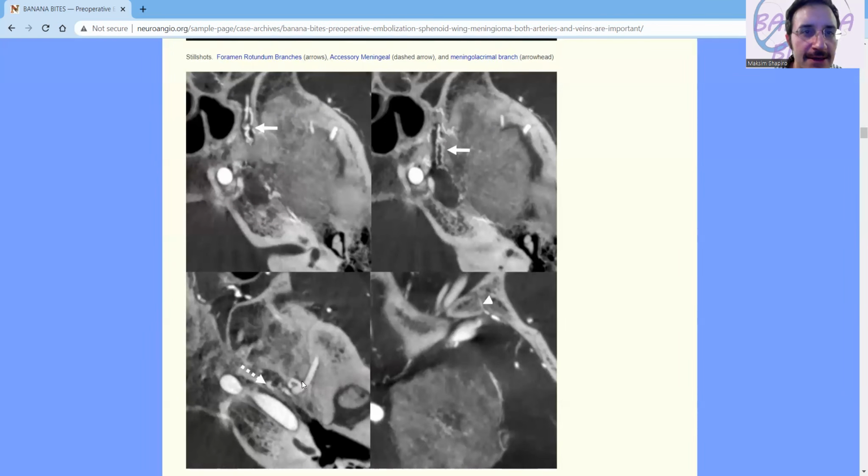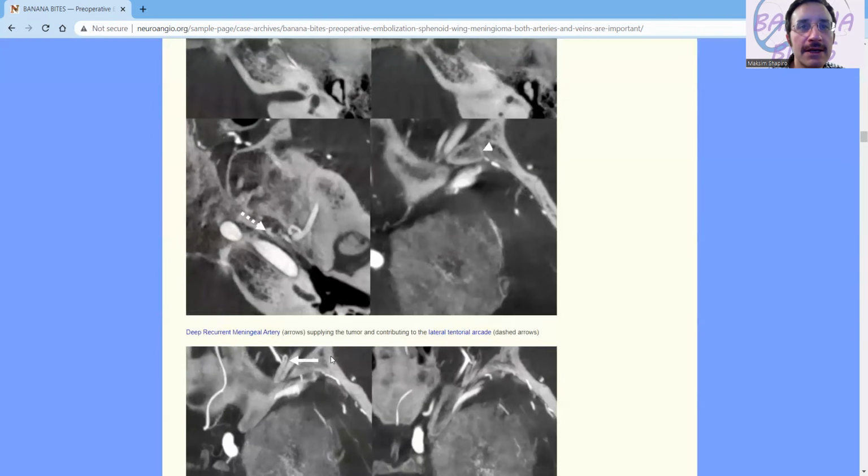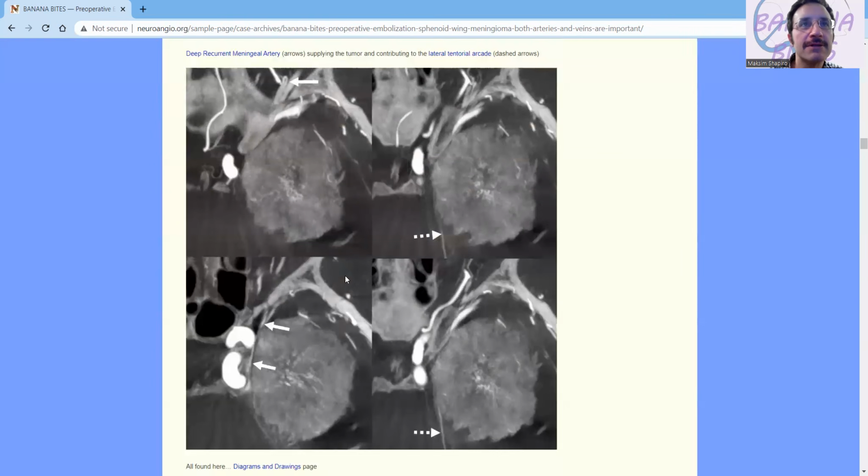Okay, now, right here, you see a faint little branch going towards, you know where, right? This is a proximal middle meningeal artery, so that's going to be the petrosal branch heading towards the facial nerve canal. Okay. Now, here we start to see some things not so immediately appreciable, but equally important. This is the ophthalmic artery, of course. Now, here's a little hairpin turn.